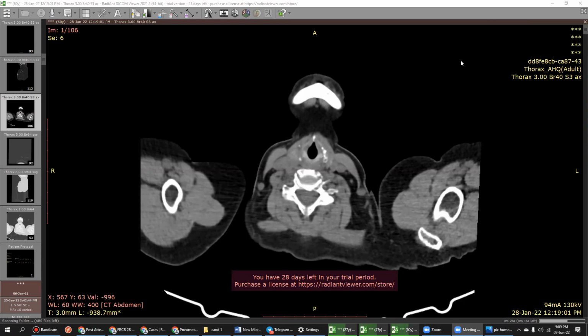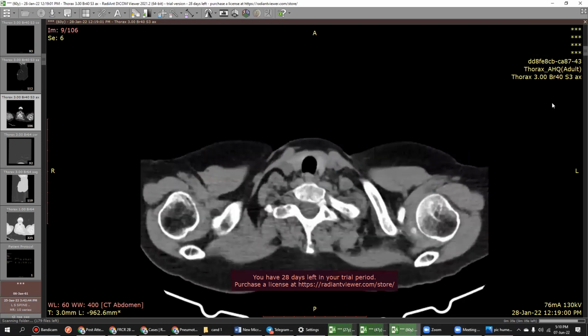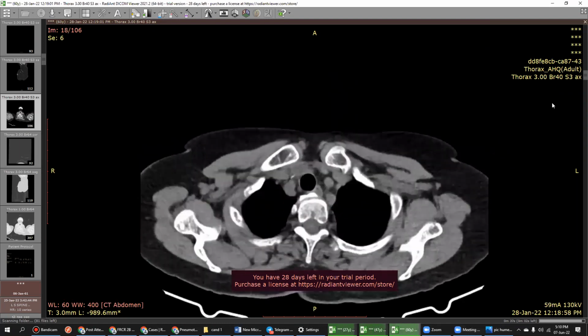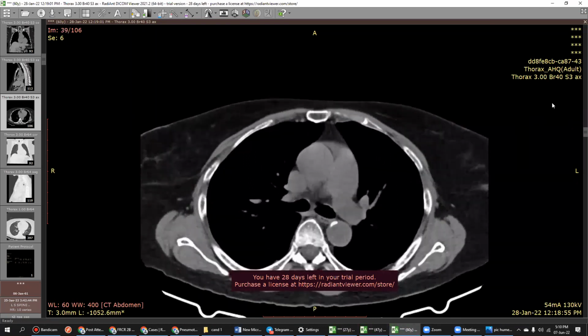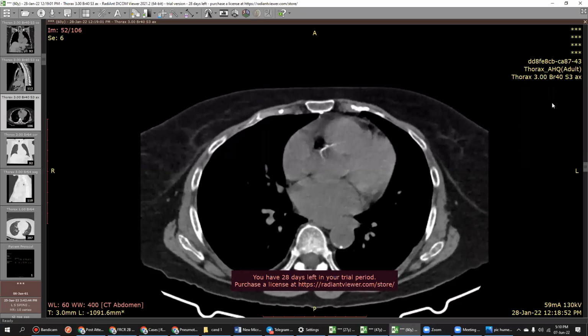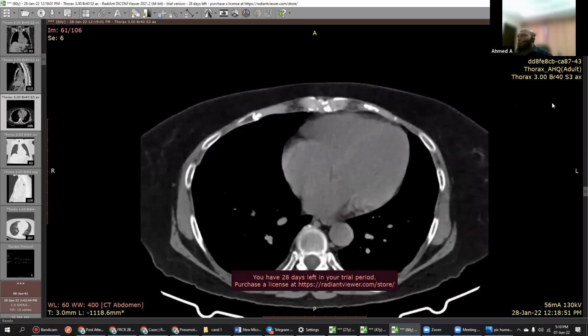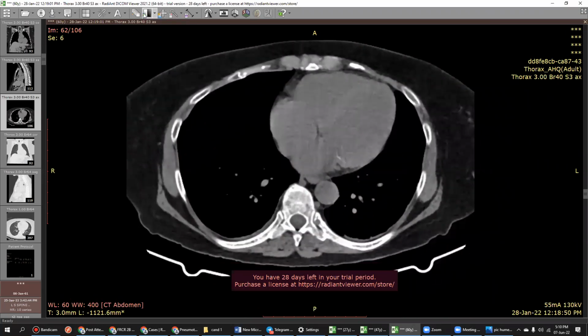Just relax. You can get the cases if you just relax and go through. Okay. So don't worry. I've been provided with axial images of non-contrast enhanced CT of the thorax. I'm just going from up to down. Can you just leave your mouse once? I'll just help you. Yes, please. Okay, now you can scroll.